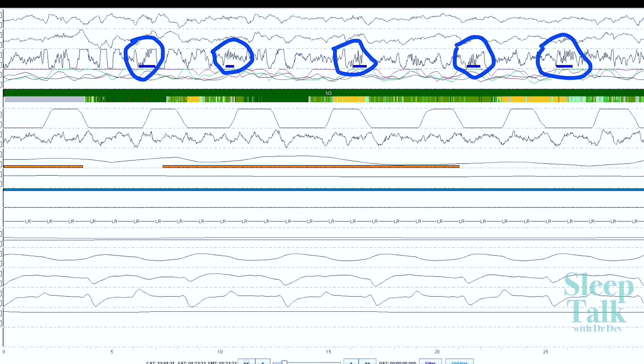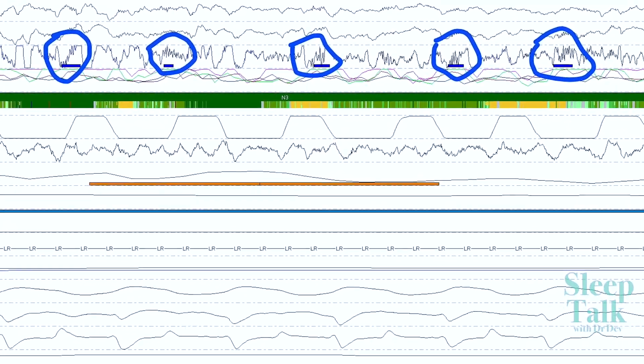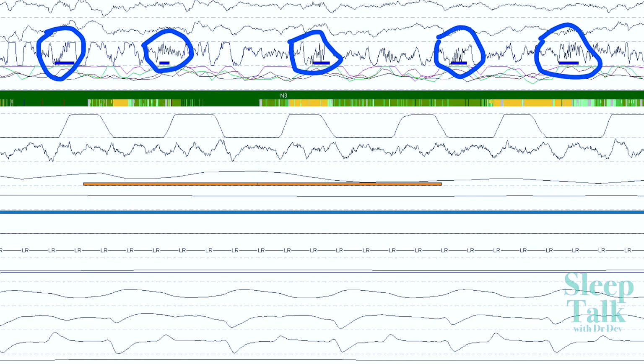So when I analyse someone's sleep test, I like to know obviously how much sleep they got, but whether they cycle in their sleep, how much deep sleep they have and how much dream sleep they have. The brainwave analysis will tell us lots of things going on with your sleep, whether you're having broken sleep or even when you are asleep, how busy your brain is. This is an example of whereby someone is asleep, but it's been interrupted by little bursts of wakefulness. It's called an alpha-delta effect. You see the alpha waves in amongst the delta waves.